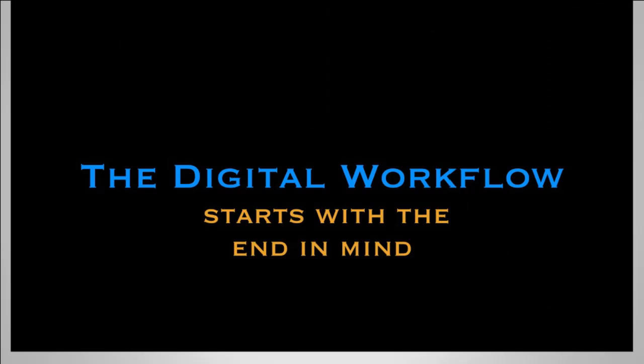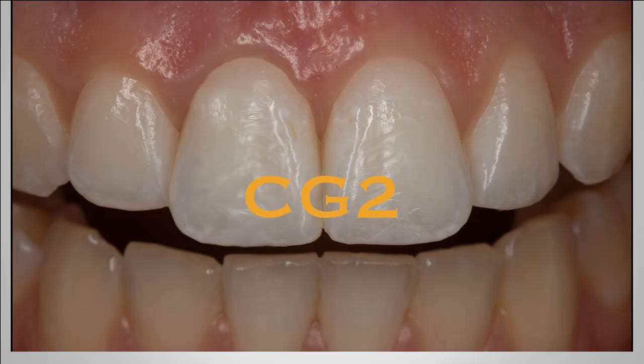Now, the digital workflow starts with the end in mind. CEREC integration is not just about the restoration, but with the appropriate CAD CAM and cone beam, the clinician has the ability to actually plan everything ahead of time, including the actual placement of the implant.